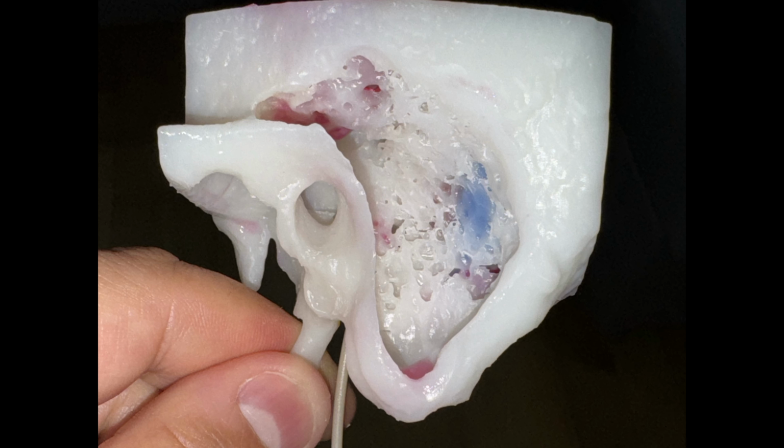The only problem with resin is that it is a bit more expensive than the filament and it's toxic. So you do have to have some setup with respirator and mask and ethanol to clean it. So it's a bit less straightforward than the filament printers, but it gives you much better quality, and the haptic feedback from drilling resin is really close to the bone.